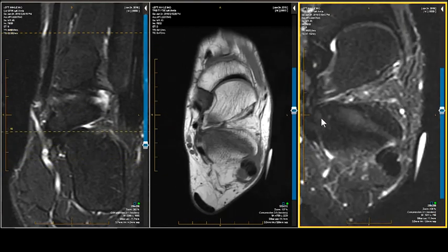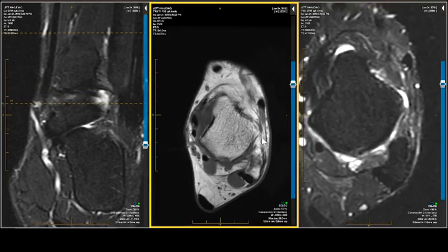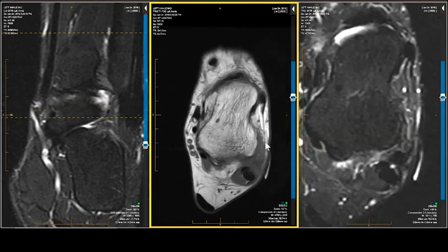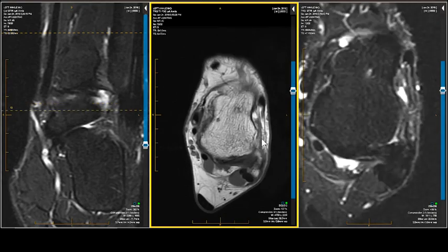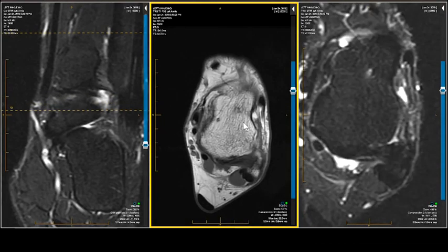Nothing of consequence. Is the anterior talofibular ligament entrapped in the joint? No, it's not. In fact, it's this wispy little thing. You can hardly even see it. For if it was entrapped in the joint, you'd have to extract it. So that's also on our checklist.